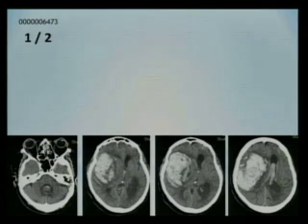Hematomas. Okay. A hematoma is one of the few things that is bright on CT without contrast. And they're often in the basal ganglia. This is actually going beyond that. And they are often hypertensive. So you have a large, bright white area, mass effect, and midline displacement, contralateral.